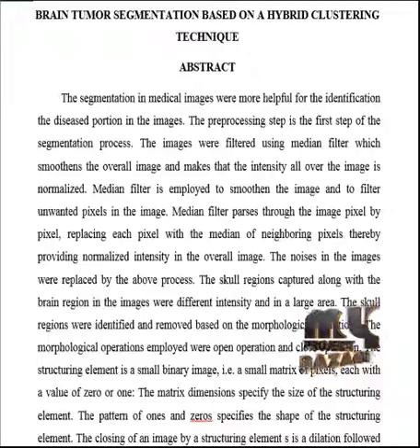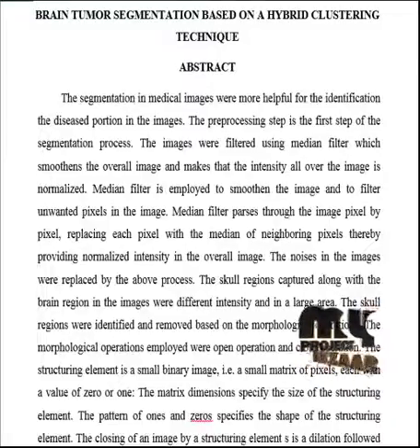Let us see the abstract of the process brain tumor segmentation based on hybrid clustering technique. Segmentation in medical images is very helpful in identification of the diseased portion in the input images. Preprocessing is the first step of the segmentation process.